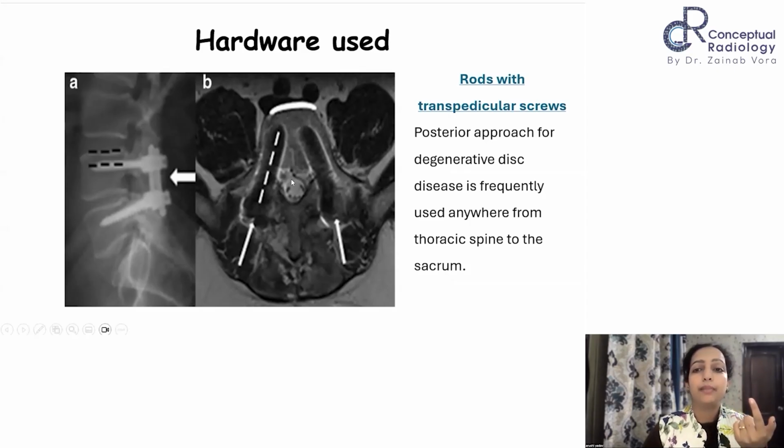It should not be either medialized or lateralized, right? So it should be coursing through the pedicular margins, the pedicular margins, and should not come medially or laterally. In those scenarios, it is displaced, right? And this approach is pretty common from dorsal to lumbar. So very commonly, you will see this approach in clinical practice.